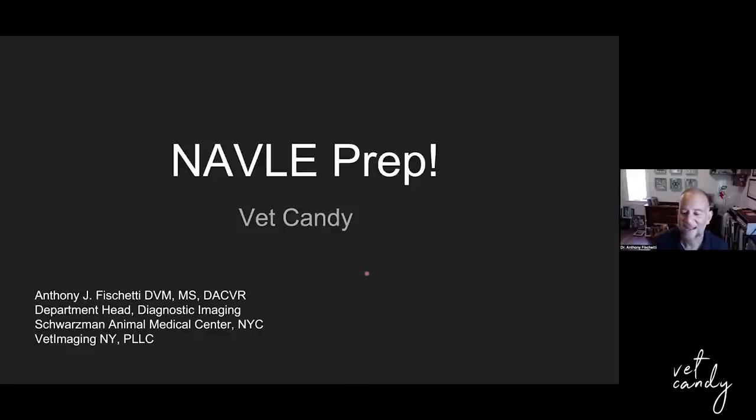Let's get at it. I like to call this basically radiology flashcards. It's gonna be somewhat fast-paced, and we're gonna go through different systems on the common abnormalities that you would see on a dog or a cat. I have mostly dogs and cats for preparation today. Sorry, no pigs, no large animal. We can't fit them in the elevator at AMC.